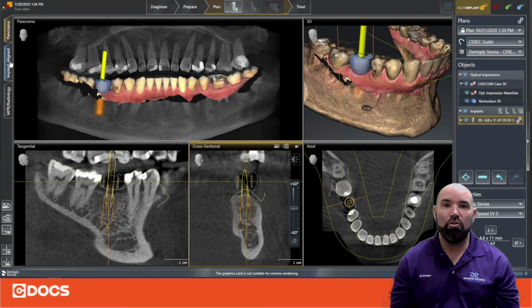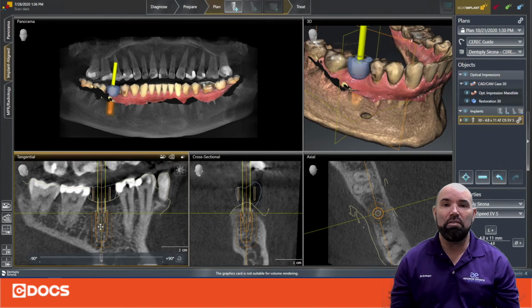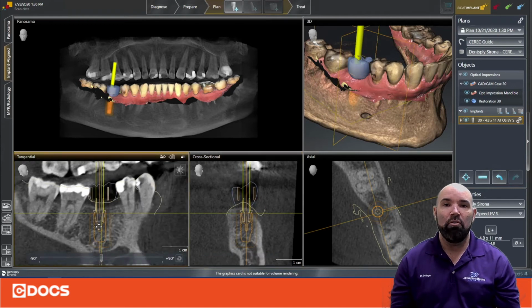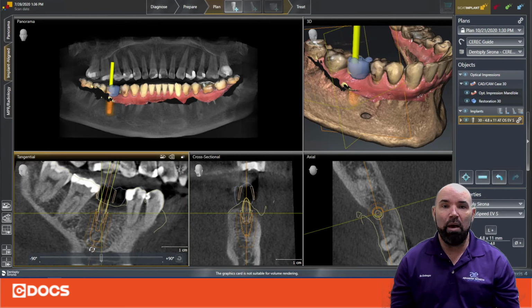So I'm going to switch over to that version and notice what happens when I tilt or move the implant. As I move the implant, the CT scan reorganizes around the implant so that the virtual implant remains vertical in the screen. Okay, the problem with this, the drawback, is as you move the implant, it still looks like it's perfectly vertical, but it could be dramatically off.